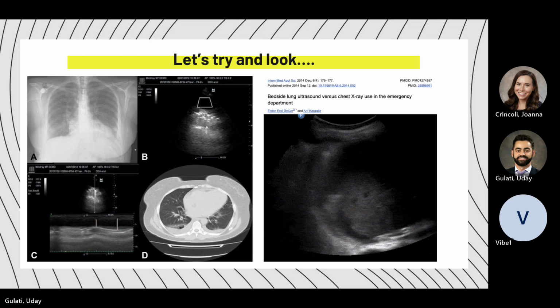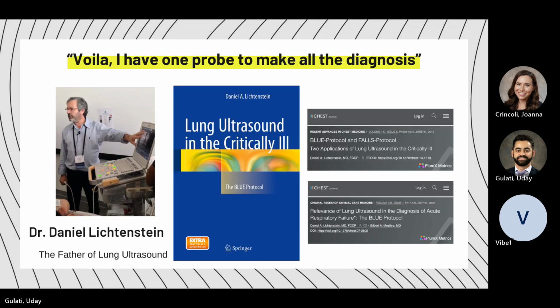And so CT was done once the patient was stabilized, and you could see a pretty prominent consolidation in the right lower lobe with bilateral pleural effusions. And what they did was that they saw some sediment in the bilateral pleural effusions, concerning for a parapneumonic effusion.